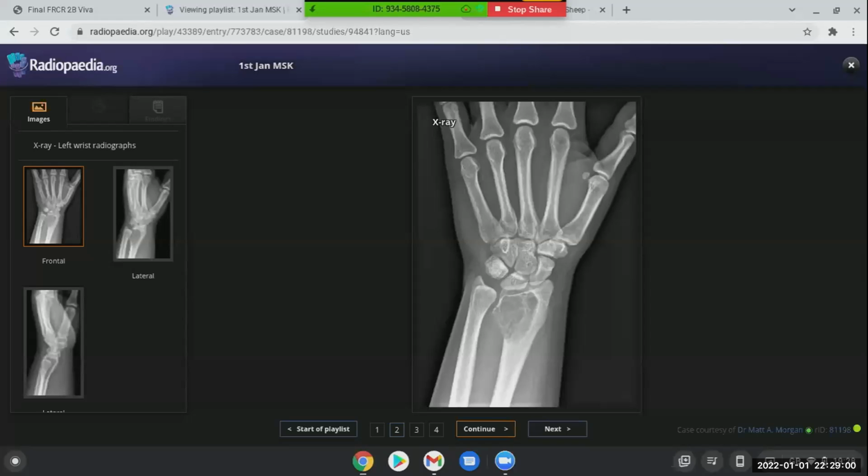So I would discuss the case with the referring physician. I may request MRI to check for further possibilities, maybe fluid levels, which could suggest a diagnosis of aneurysmal bone cyst over a giant cell tumor. That's it.